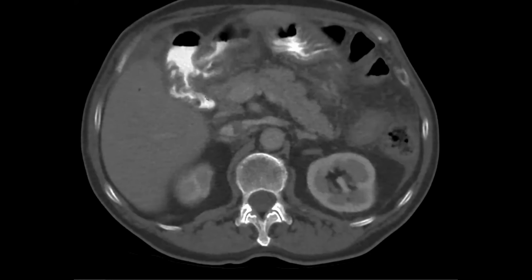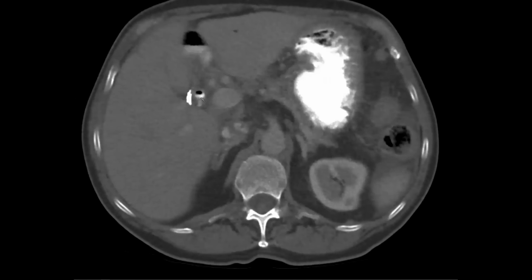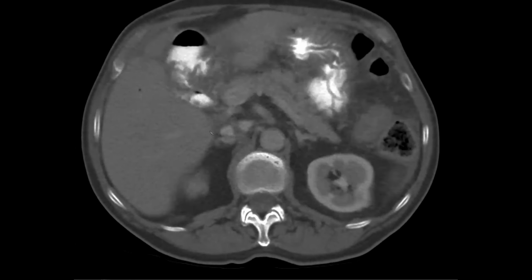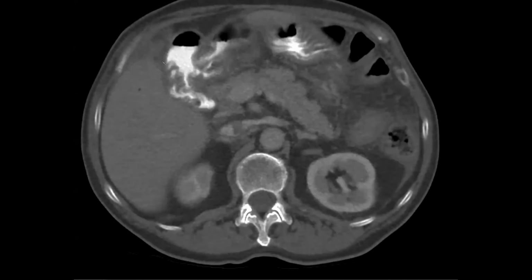And in this case, contrast that was in the duodenum was kind of going into the bile duct and then going both up and then down through the common bile duct. But it's a way to, if there's a distal common bile duct stricture, to drain the bile into the duodenum there. And then we learned that there is a syndrome associated with this. It's rare, but does anyone know any problems that come up with this kind of surgery?